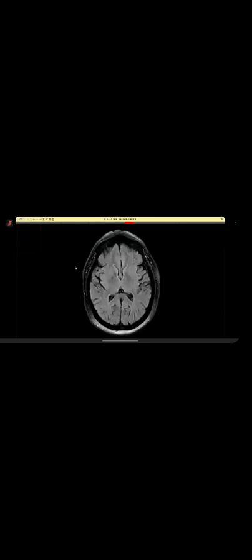The images are scrolling very fast. Okay, let me scroll for you. Leave it. Yes, sir. So I am scrolling for you. So looking at the images, I'm not able to appreciate any significant pathology in these.